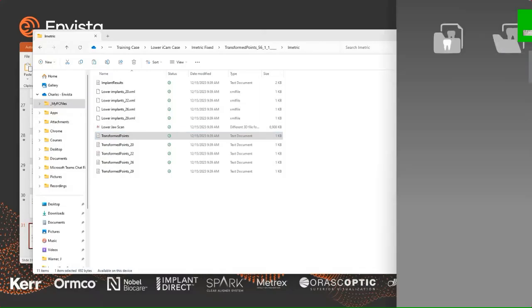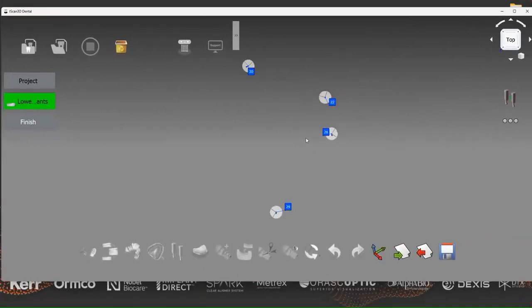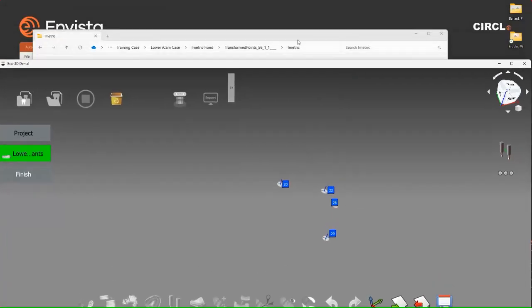And let me pull that into the screen here. All right, so these are now your coordinates. Now, as I mentioned, you can't change how the relationship from these are. Now, I like working with the coordinates. Actually, the coordinates are more accurate than STLs. Some of the other systems only give you an STL to STL comparison. This is the actual coordinates, and that's helpful for us.